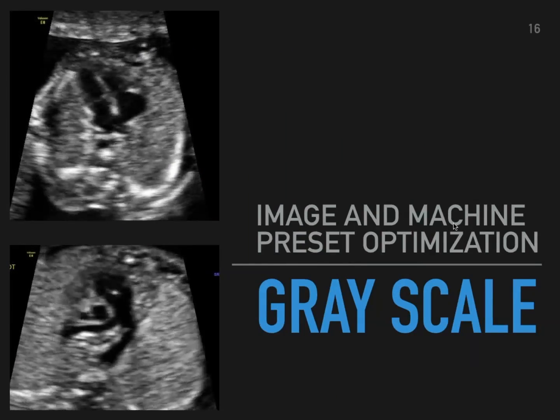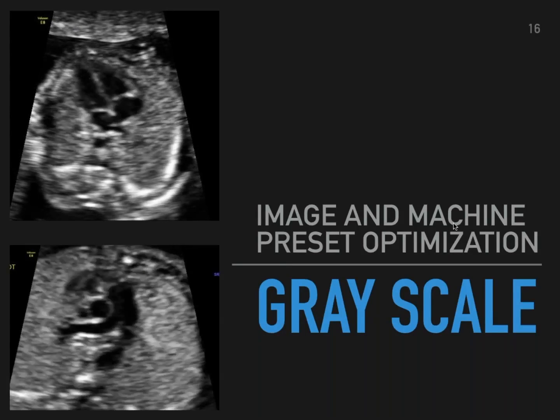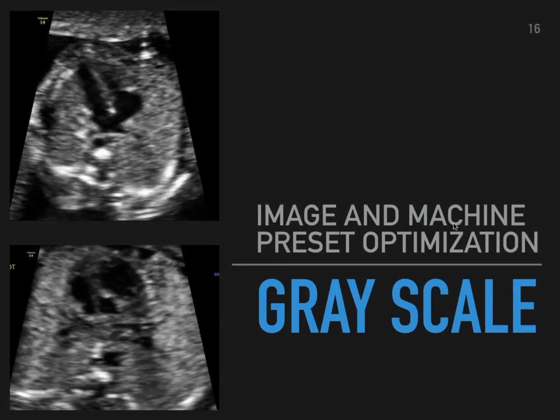Image and machine preset optimization. Just understanding your knobs and how they affect your image.